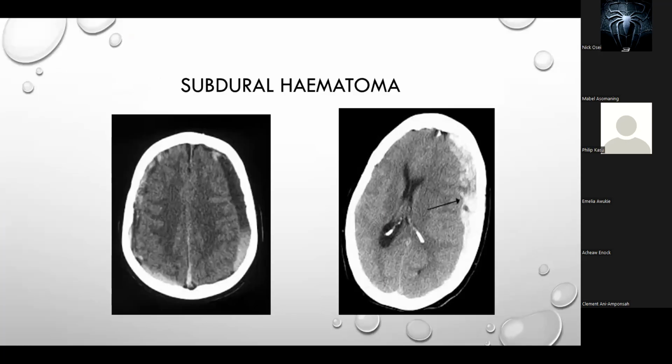All right. Where was I? Yes, so as I was saying, there's something else going on in this CT scan. You realize that aside from the bleeding that is seen here, the acute bleed, the ventricles are also not looking fine. Now, if you look, you realize that the midline is shifted.